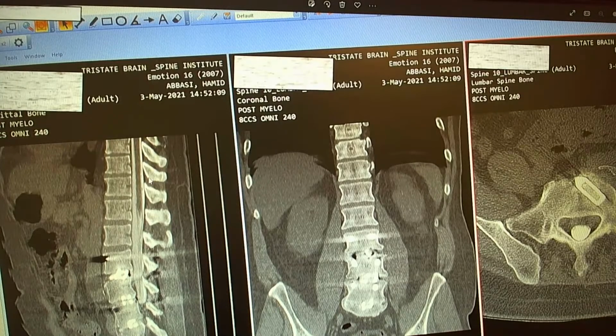In the center of the photo are those lateral muscles or psoas. Let me see if I understand the question. Christina is asking about the center photo here. Christina, are you talking about this muscle here? Yes, okay.